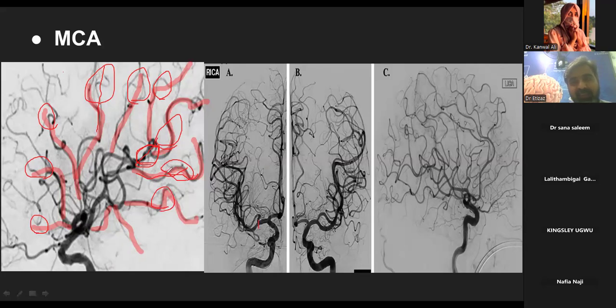It gives some branches to the parieto-occipital area. Posterior temporal, sir. Posterior temporal is below, this is the upper area. Sorry, I am talking in Hindi. So this is above. Angular? Sorry? Angular arteries. This is angular artery.